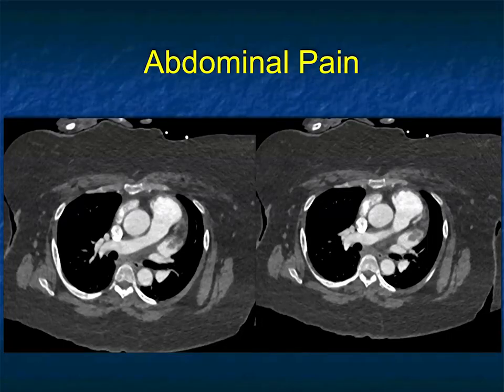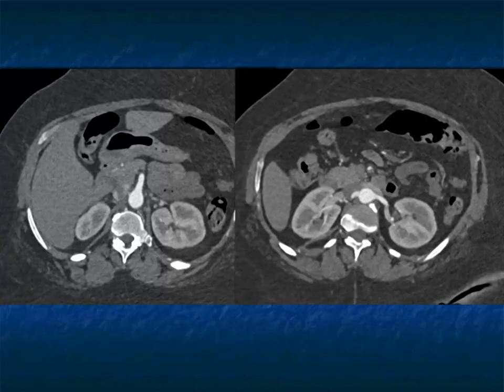Now, when you look at other images, we need to be careful to look at the entire scan. Here's a patient with a chest CT with this clot in the patient's left atrial appendage. You have to worry that clot can go anywhere. It can go to and give you PEs. It can give you a brain infarct. It could give you occlusion of the SFA and lower extremity symptoms, or it can go to the SMA.